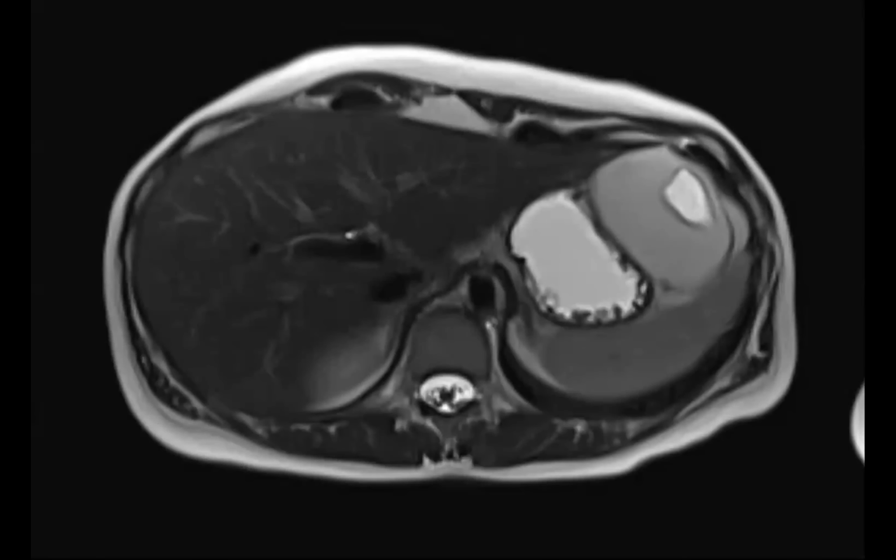At least what I'm finding in Radiographics and Radiopaedia says they can have central necrosis or liquefaction, maybe the result of ischemia or hemorrhage. Okay. I don't know exactly if scar is the proper term, but it is generally very T2 bright and does not end up progressively enhancing. Yeah. Awesome. So it's just a cute little mimic, and even an EUS can be hard to tell.